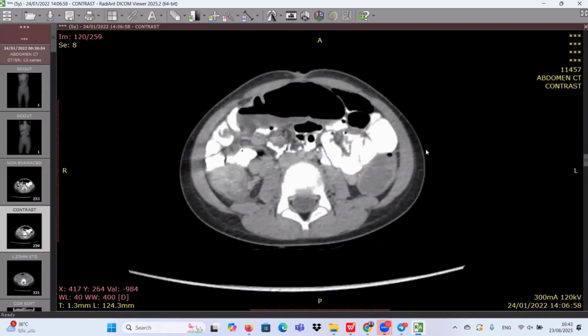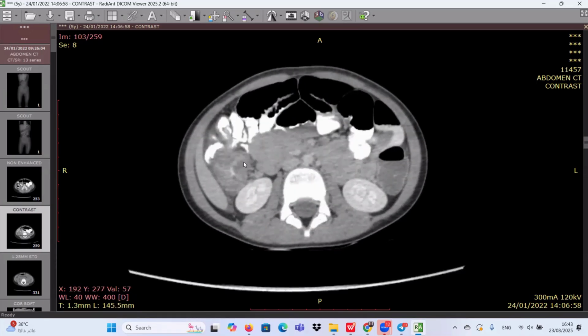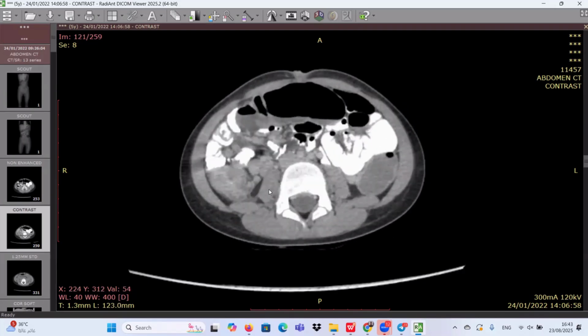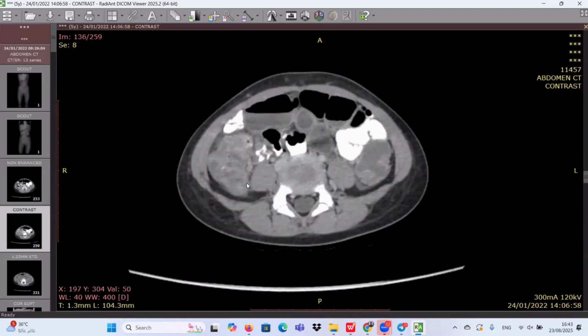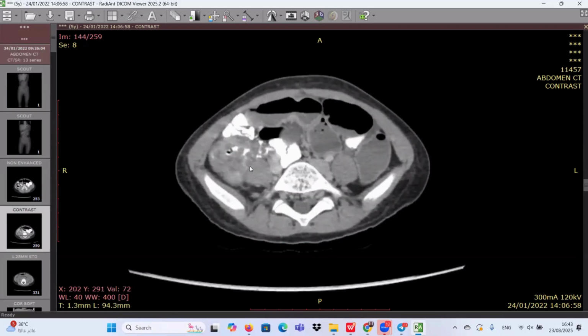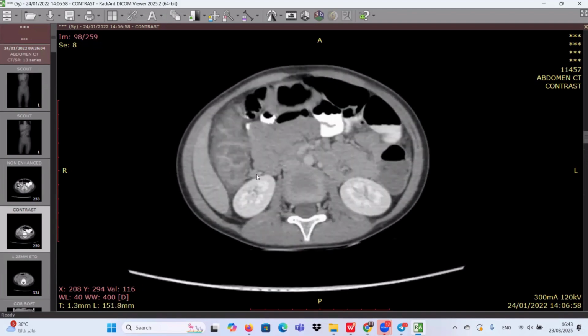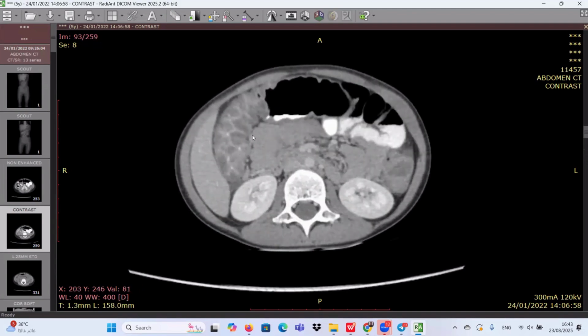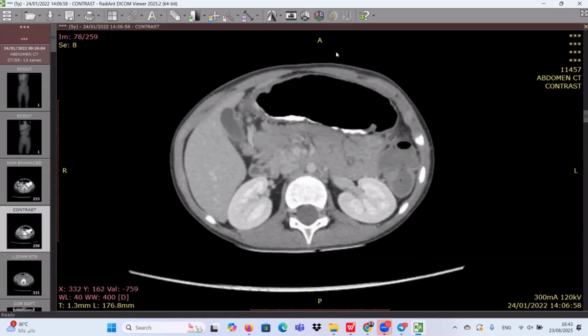Can I stop you here, please? You said that we have circumferential wall thickening and edematous haustra, and these haustra make the accordion sign. I think it's better to see it in the coronal plane. Look for these haustra and the mucosal and submucosal edema, and it's involving the ascending colon till the hepatic flexure, and we have a dilatation of the transverse colon.